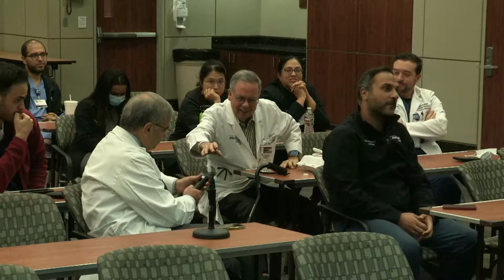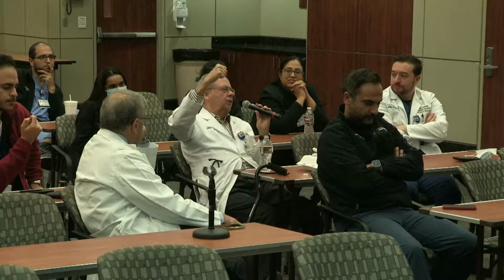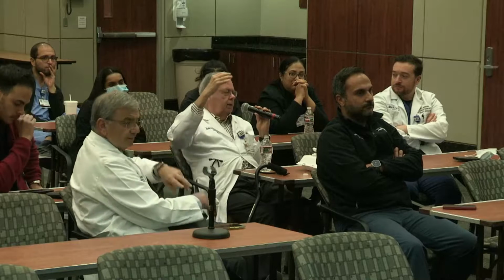Quick question, if I may. Yes, sir. In our outpatient practice, the majority of calcium scores are for prevention. So these are asymptomatic patients that we're doing a prevention algorithm. And in the past, or actually not even the past, even recent present, the usual pattern has been over 400, let's do a SPECT. So are you strongly suggesting that we should skip the SPECT and go to the PET? That's the first question. It sounds like the answer is yes.